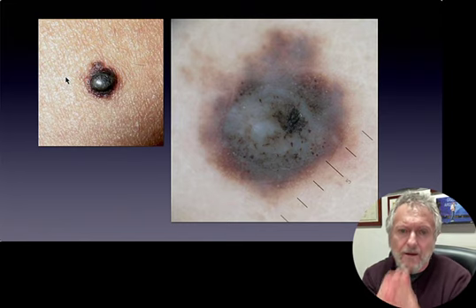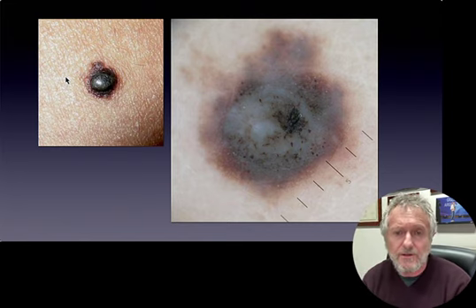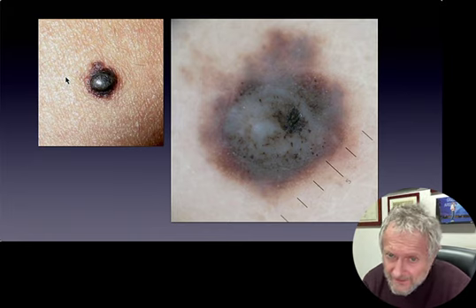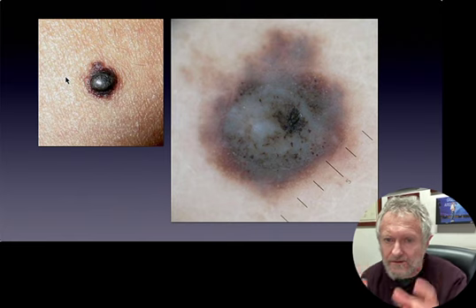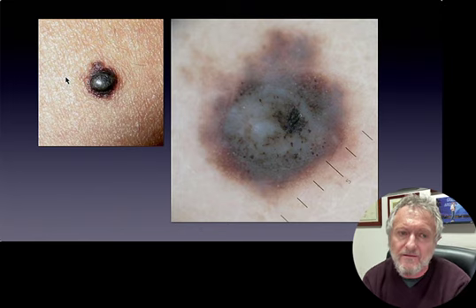Okay, now another example of a predominantly blue lesion, but here again, what do you see around the blue color? Well, we see a lot of black color, black dots and black blotches, and also a little bit of a network at the periphery. Here the presence of the network is the main characteristic for why we think this could be a nodular or predominantly nodular melanoma.